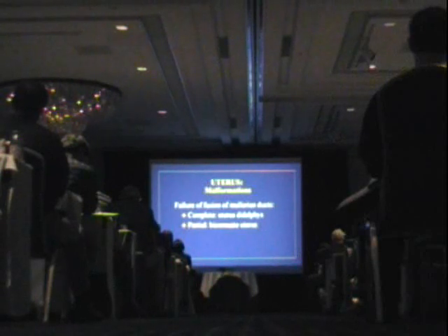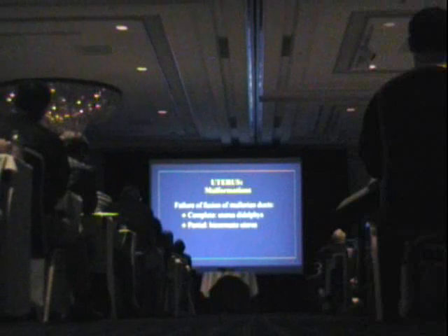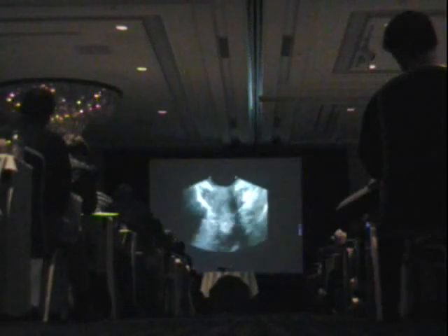Another uterine malformation, failure of fusion of the two ducts. If this happens, if it's a complete failure of fusion, we see a uterus didelphys. If there's fusion inferiorly but no fusion at the top, that's your well-known bicornuate uterus.